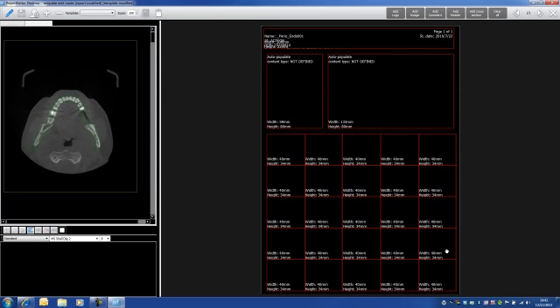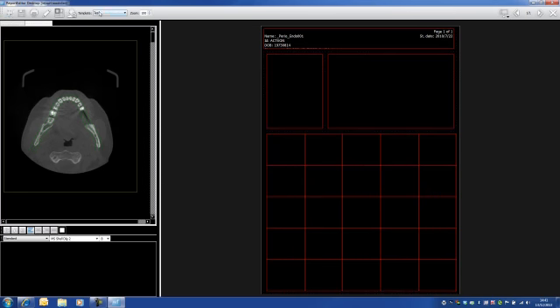Perfect. My template is created. I go save here. I name it, let's say, a test. Okay. I deselect the pencil and my template appears here in template. The day I have more templates, of course, a scrolling bar will come down and I will be able to choose the template that I like.